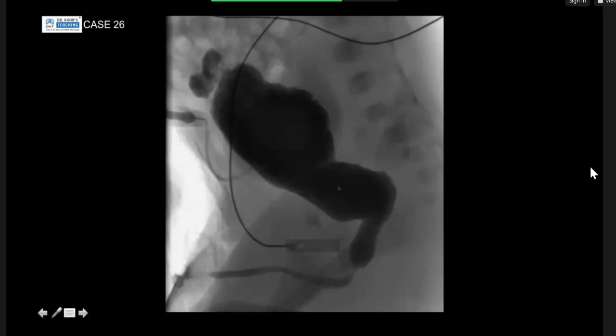Yeah, this was very good. Well done. This is a case of posterior urethral valves. If it was going to be a dilated ureter, you tend to see them coming posterior to the bladder on the lateral view, rather than starting at the dome of the bladder, just to help you differentiate between reflux and diverticulum. And these look very rounded to be refluxing ureters. So you're completely correct. This is a case of posterior urethral valves with evidence of bladder outlet obstruction, because you can see trabeculation of the bladder and diverticulum.